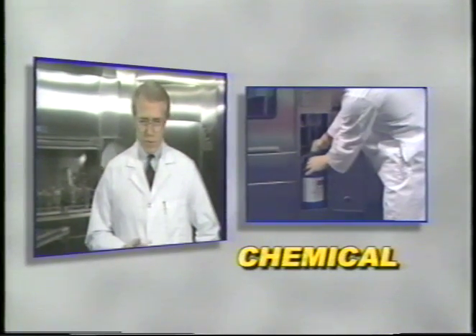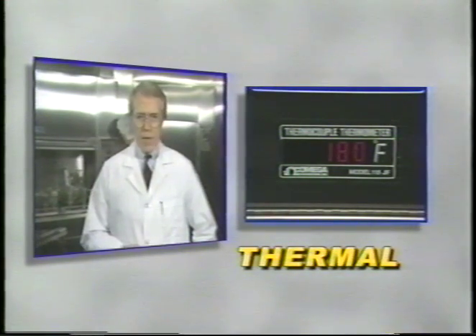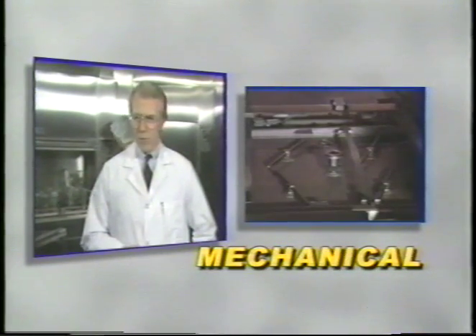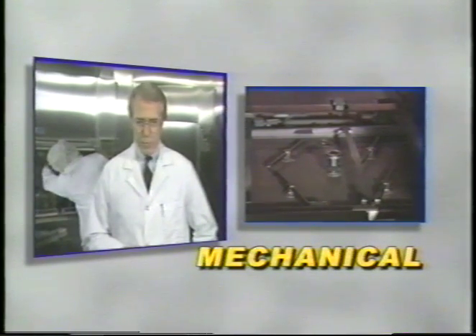In either case, manual or mechanical cleaning will utilize three types of energy. They include chemical, or use of some type of detergent; thermal, referring to a specific temperature; and mechanical action, the use of old-fashioned elbow grease or multi-directional reciprocating spray arms. Regardless of the type of surfaces we wash, skin, equipment, glassware, cages, or environmental surfaces, the components involved in the washing process remain the same.